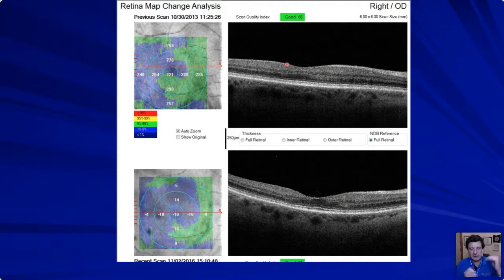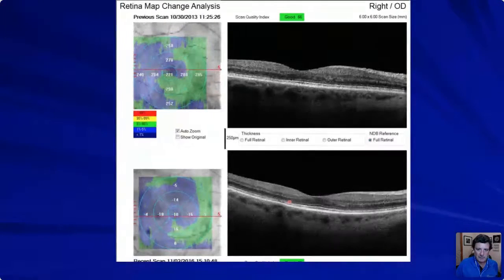Now, I understand that there's epiretinal membranes and vitreomacular traction that can distort that, but look how flat this looks here, and it's even a little bit more obvious on the left eye. See how we're kind of losing this up here? Well, if this is changing down here, this is kind of flattening. So just look at the contour here and the contour here, and we definitely can see at least the photoreceptors are intact. And right here, we're starting to get a little concerned about the photoreceptors and this nuclear layer. We finally decided to change this for this patient, so they didn't end up worse, and they switched to a different medication.